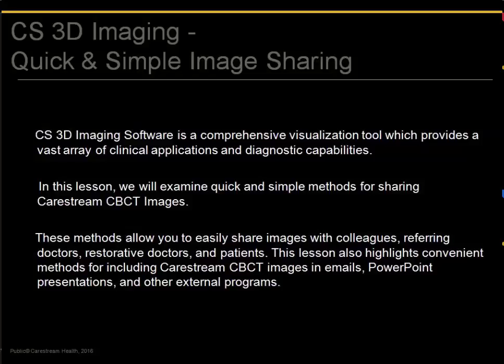Perhaps you found an image that perfectly displays the region of interest in the scan, or you have done virtual measurements or placed a virtual implant and would like to include these images in an email, an article you are writing, or a PowerPoint presentation. This lesson will show you how to do all of these things and more.